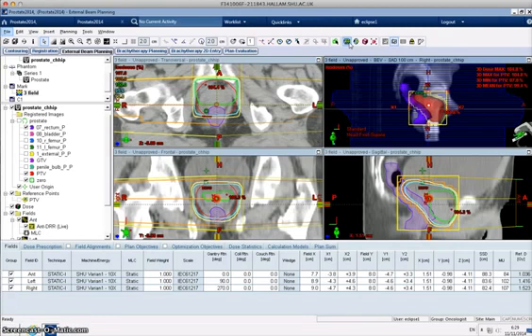So in the clinical environment you would do a combination of these all at the same time, and with experience clearly you can do that, but what we're going to do is have a look at them step by step to see what each of them do, and then once you've got some experience and practice of doing that, you can do them in combination with each other.